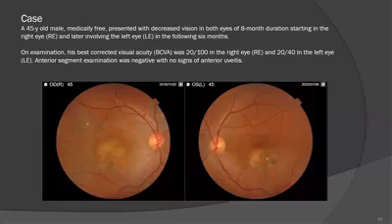Dr. Fawaz, can I ask you regarding this case? You did OCT angiography, and you could not detect any CNV, right? Yes, sure. I didn't show it in my presentation. I almost do all the imaging modalities for my patient, because at the end we need to find out the diagnosis. This case, by the way, was not an easy case. The crucial thing was the fundus autofluorescence, which made me suspect that this is a case of chronic CSR.